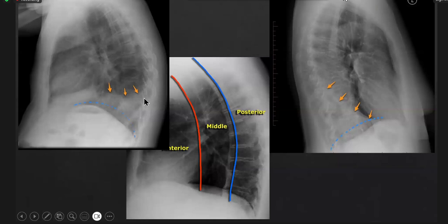So that is the way. And one mnemonic I always say is DDD. In a normal lateral chest X-ray, density decreases downwards. The density of the spine decreases downwards. Why? Because the air component becomes higher. The mass of the lung is higher on the lower side, and on the upper side, scapula etc. make the density on a different scale. So blackness decreases, and if there is anything white, it becomes an abnormal thing. Is that okay? And here again, this is a collapse of one of the lobes. I think we will skip this as of now.